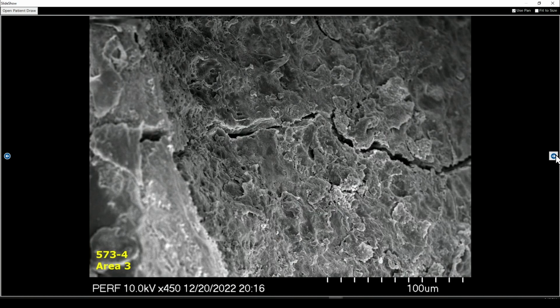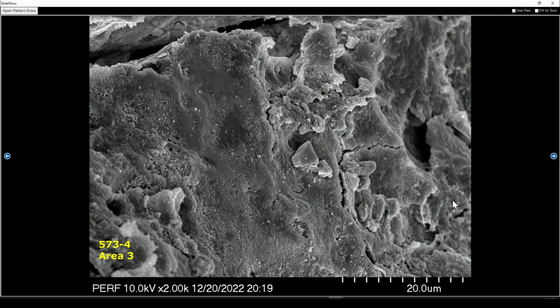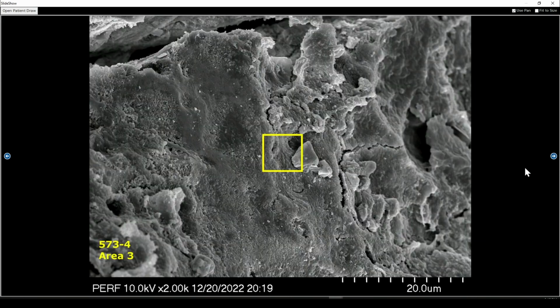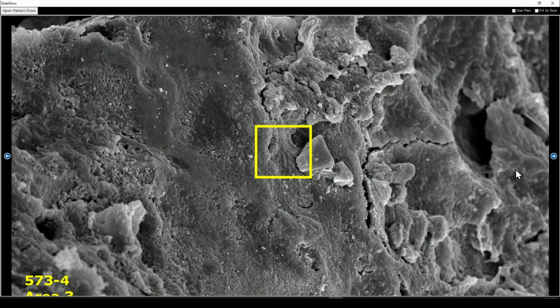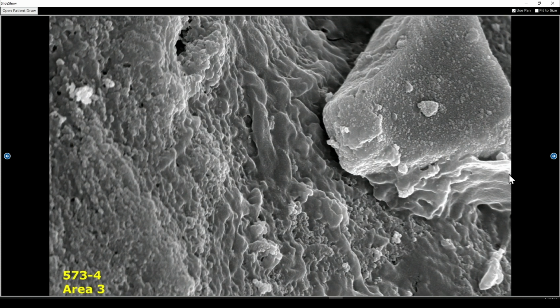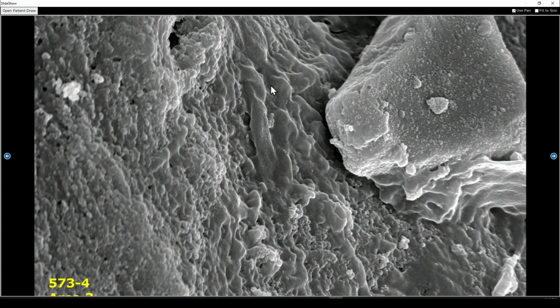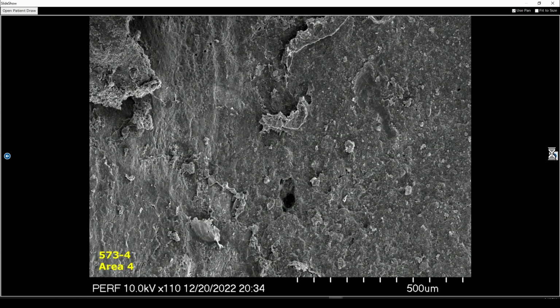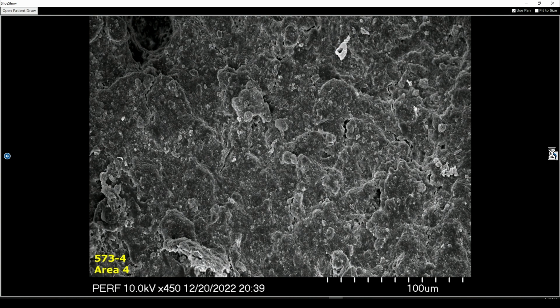Now we're actually in the canal, and we wondered whether the bacteria could actually get into the canal. And you can see here, if you're paying attention to our bacterial biofilm cases, you can see the EPS and the goo that they excrete along the dentin, and that's how they attach to the canal wall. So we looked at various places within the canal.